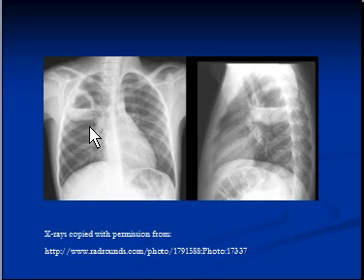If this X-ray was taken in supine position, you would still see a radiopaque circular shadow with a radiolucent shadow within it. The only thing that you won't see would be this straight line, meaning the air fluid level would not be visible. The cavity is big enough to produce a mass effect and is pushing the adjacent lung towards the mediastinum here.